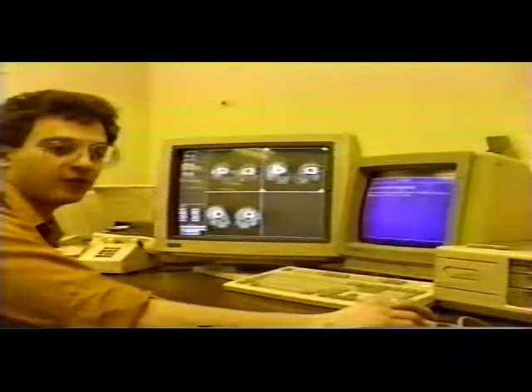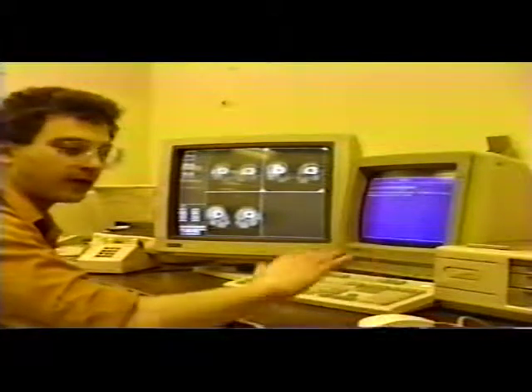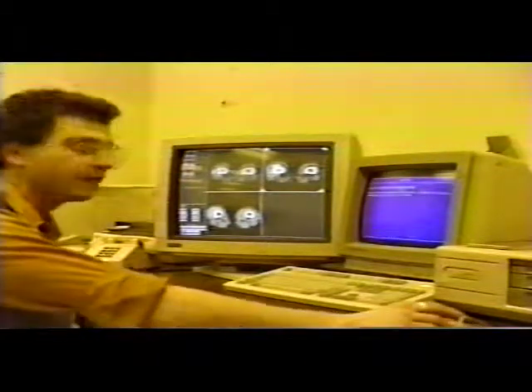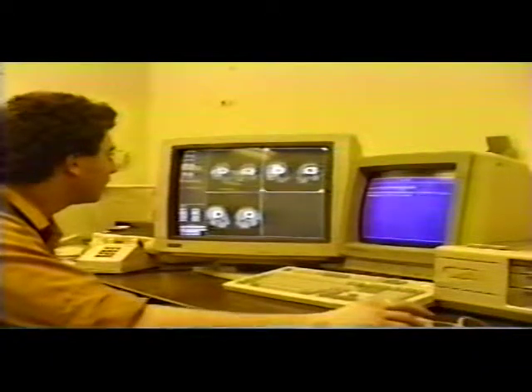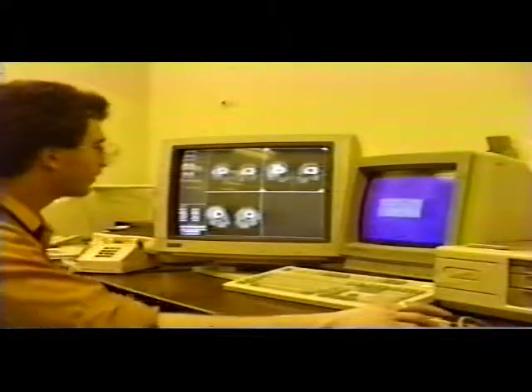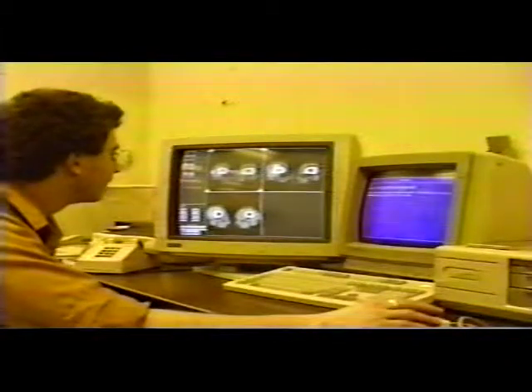And if it's getting too complicated, I can just merge it all. And when I exit, or start looking at another picture, those changes will automatically be written to the optical disc. The fact that I've deleted those regions of interest. And let's put a line here. Now when I look at another image that writes it to the disk, this is the right time.